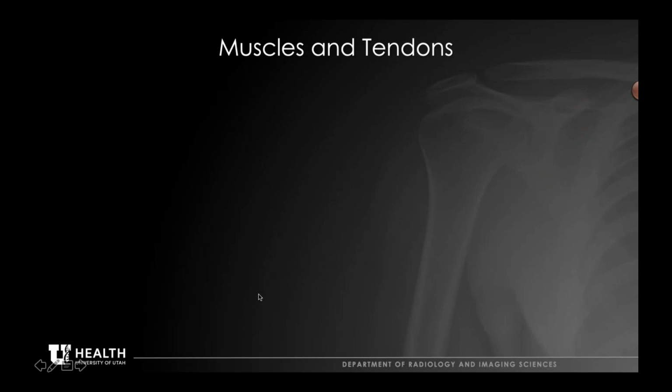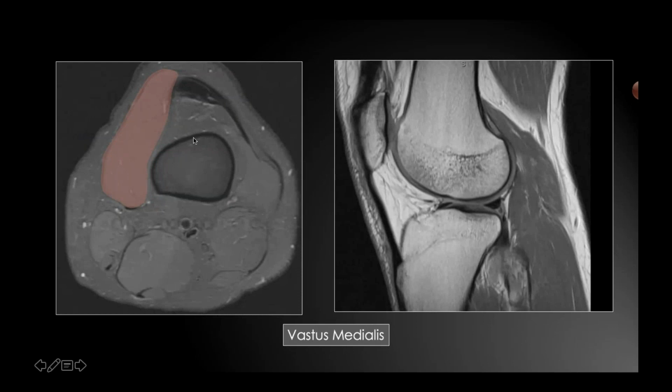And yeah, it's probably been a couple of years, since I think most of you are third and fourth years, but that's okay. It's a good refresher. So first of all, we're looking at an axial slice here. It's as though we're standing at the foot of the patient and looking up towards their head. That's how most imaging is oriented.